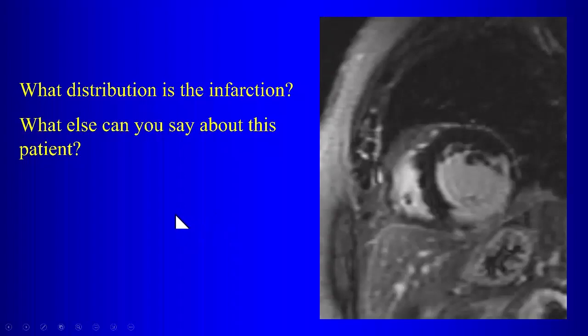What about this? No, right, and a left. I was going to say left dominant. Yeah, that's correct. So this is an infarct here along the circumflex, but also involves the posterior wall, right? So this is a left dominant circulation. So this is an infarct in a patient who's left coronary artery dominant. Okay.